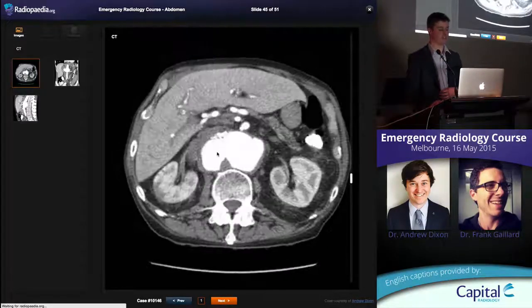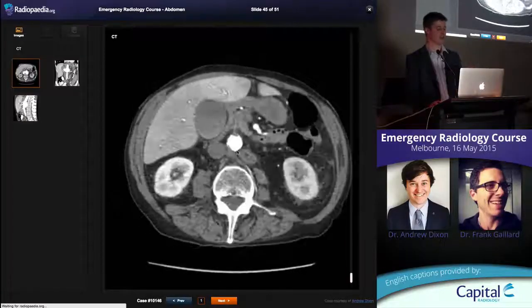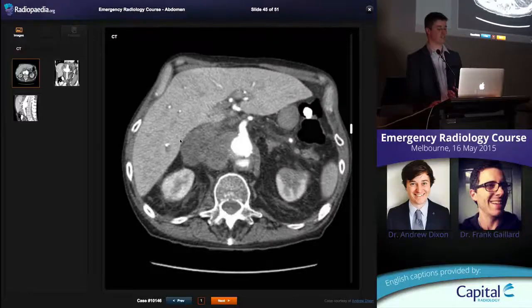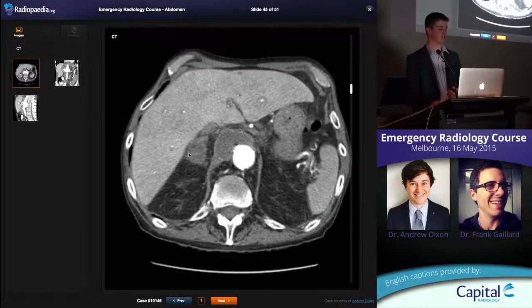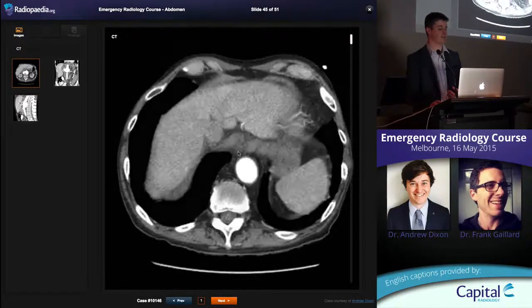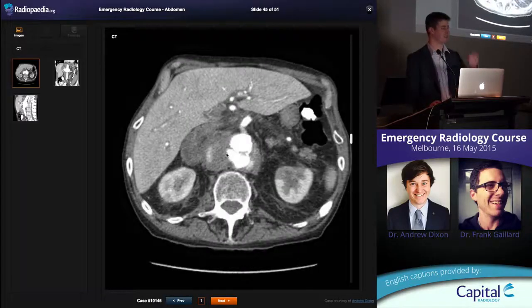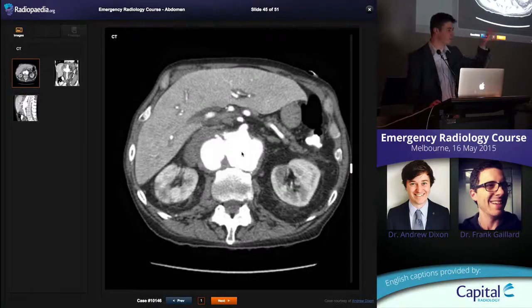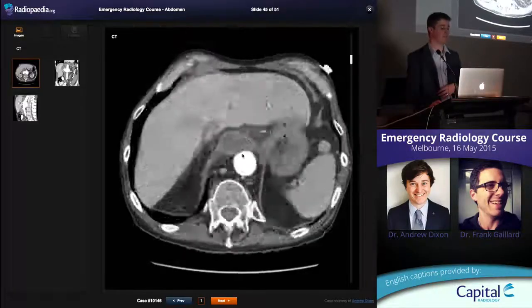This final vascular case, if you have a very irregular, lobulated looking aneurysm, okay, and you've got here some fluid collection sitting in the adrenal gland, fluid collection sitting in the diaphragmatic crus. This is a mycotic aneurysm, so an infected aneurysm. It's occurred in a funny spot. They're always very irregular like this. These rupture the wall out one way and you get these collections next to it.